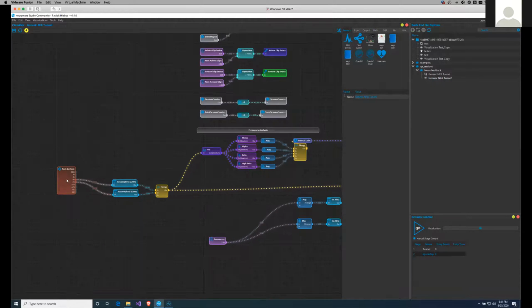You can change the sensor in the front here. For the sake of that demonstration, we use the test system, but you could also use an OpenBCI. You could use the Muse. We recently added support for the Ego devices if you have one of those, and more devices to come. And like already covered in one of the previous sessions, if you have a totally different device, you can always stream in OSC data and use that as the real-time biodata input from a studio perspective. We also have an LSL plugin now, so you can stream to LSL and then forward that onto OSC. Exactly. So that's on the README of the project page if you guys are interested in that too.